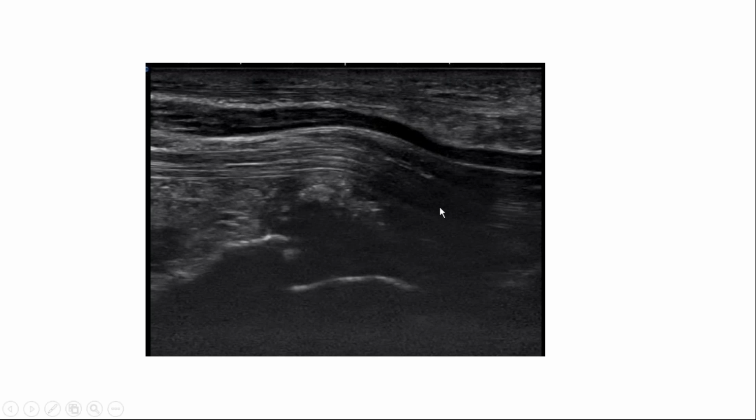So let's say you have a busy day and you did an exam and you know that they have carpal tunnel syndrome and you find their nerve to be 0.12, and then you get a long axis just because you want to get two views. Would you stop here? What do you see different in this image?